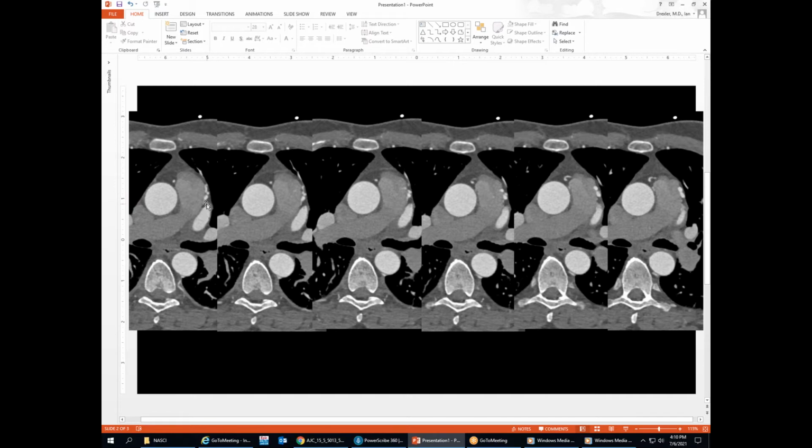I'm going to try first showing it as a movie. I'll try to slow it down. Sorry, let's see if I can slow it down quickly. Well, let me just replay this.